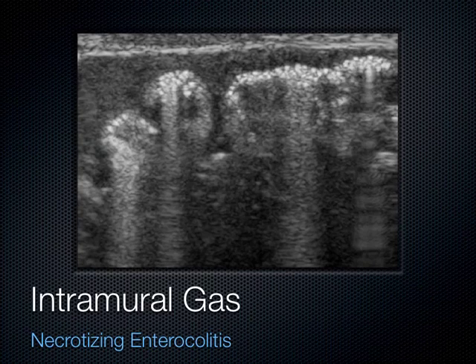And just another example of a patient with necrotizing enterocolitis. We can see all these punctate lesions here with some shadows. Now, people always ask me, does air cause dark shadows or bright shadows? It causes both. Sometimes it causes dark shadows, sometimes it causes bright shadows. There's a term for this that we use sometimes in medicine. It's called dirty shadows. Dirty shadows is when air comes from the bowel. And so whenever you have air coming from the bowel, it's termed dirty shadows, kind of because it's coming from where all the poop is. And so that's why people call it that, I think. But we can see here the total comet tail right here coming from the wall of this bowel, including up here. This is all air in the wall of the bowel.